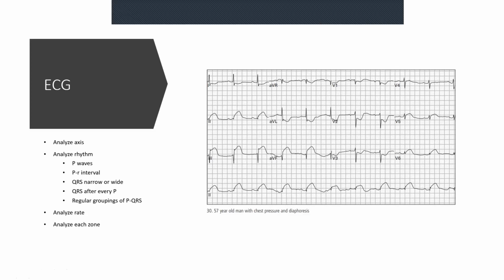So, a 57-year-old man with chest pain and diaphoresis, your first thoughts would go towards ischemia, but you've got to think of differentials as well. Pleural effusion would also fit in there. Pneumothorax may also fit in there. Pneumonia could also fit in there. Aortic dissection could also fit in there. So there's quite a few things that could fit, but I think after you've done this ECG, you might well find that it ends up being an ischemia.